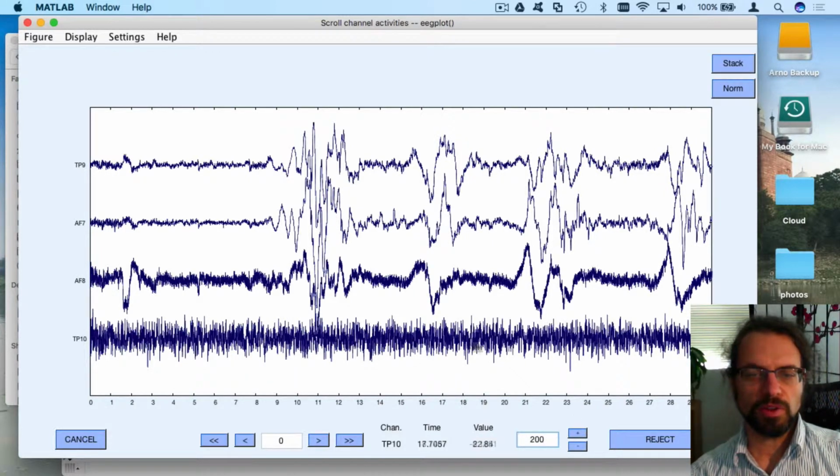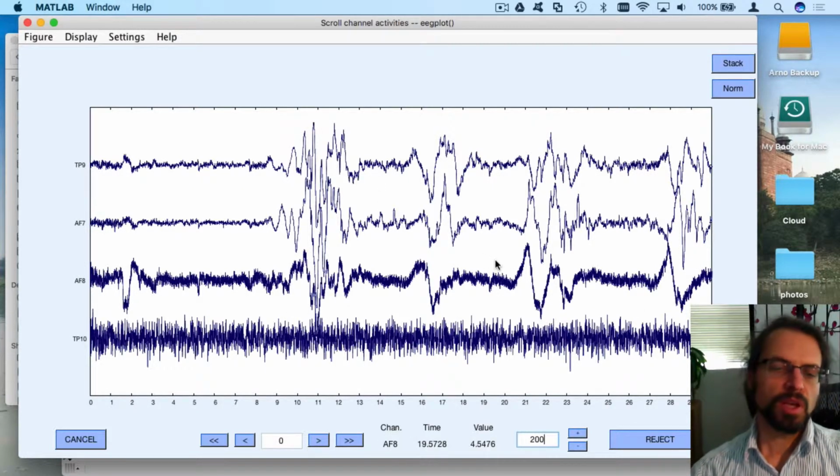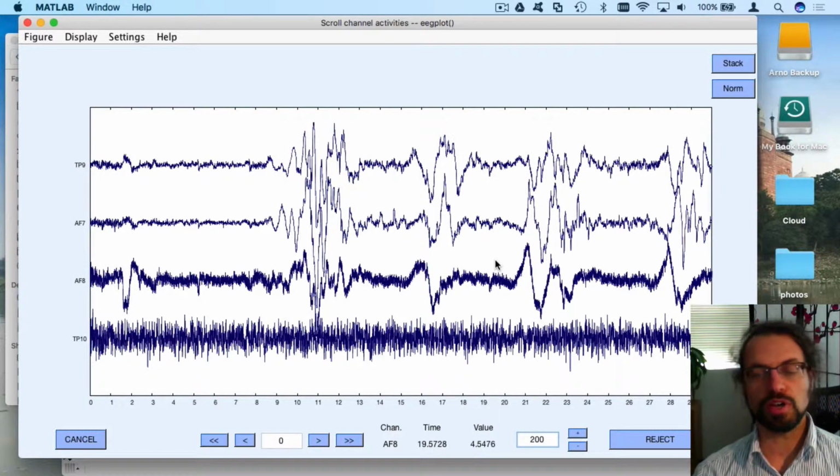This channel is bad, it's a bad channel. Here you can see these are probably blinks, so I don't want to process that. Also, for some of you, you have more data. It's like you recorded, for instance, a big portion of time in which the data wasn't being collected, so you'll have to remove that.